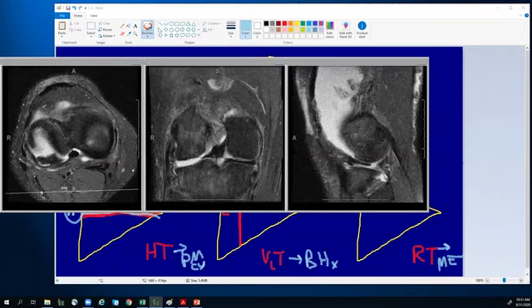All right, great. So we're going to move on to another example, again covering some of our basic tear patterns. This one might be a little bit more confusing if you've never seen something like this before. And that's the reason I'm including this axial projection when I'm looking at these coronal and sagittal projections. Because if you haven't seen a lot of these types of tears before, you might get confused just looking straight at the coronal and sagittal projections.